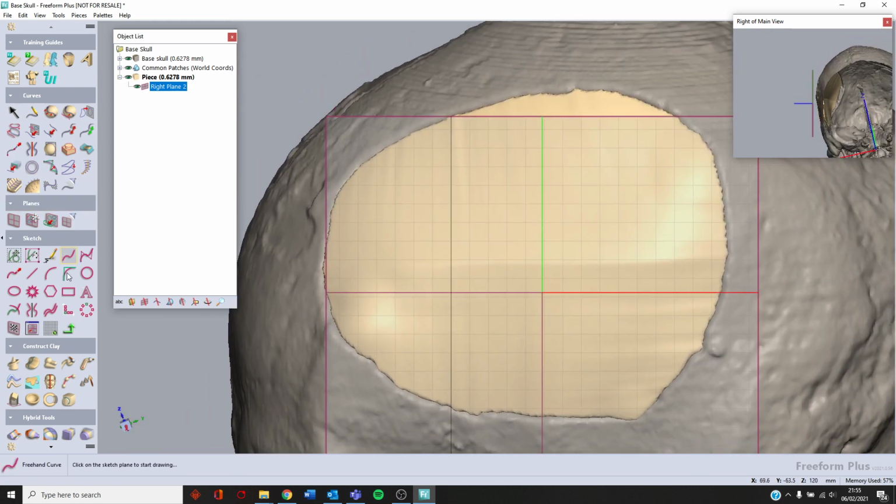And what we can add now, for example, I would just add a single hole, diameter, let's say, what are we working with? 0.6 of a millimeter coarseness, let's say 5 millimeters. Rectangular array, how many do we want? 5, maybe just one in that case.